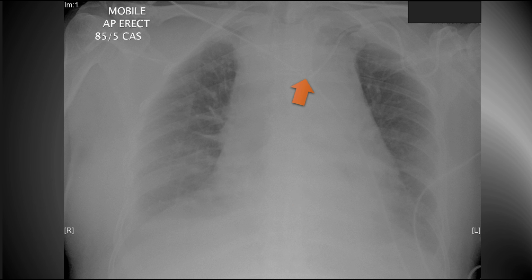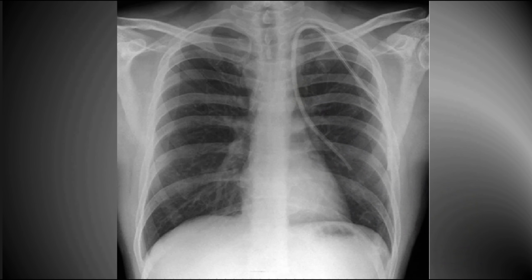This is not something that you're going to see very often. Also, keep in mind, some patients have completely anomalous venous activity going on, and this is a central line going to a location that is not identifiable by normal anatomy.